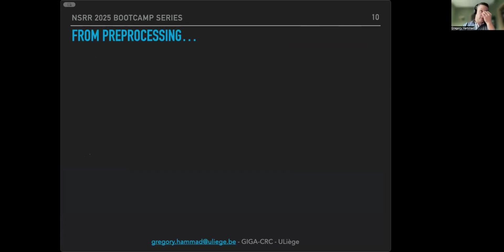Now let's go through the different functionalities, but we will not cover all of them during the tutorial. As I said, we have a unified interface to read different actigraphy formats. We are going to use a specific one within the workshop. We have the data that we circulated. Those are data that emulate the MESA dataset file format. You would ingest them with a specific function, but if you have data from other devices, you can ingest them in the same way with different functions. And then you will see that the syntax is almost similar.